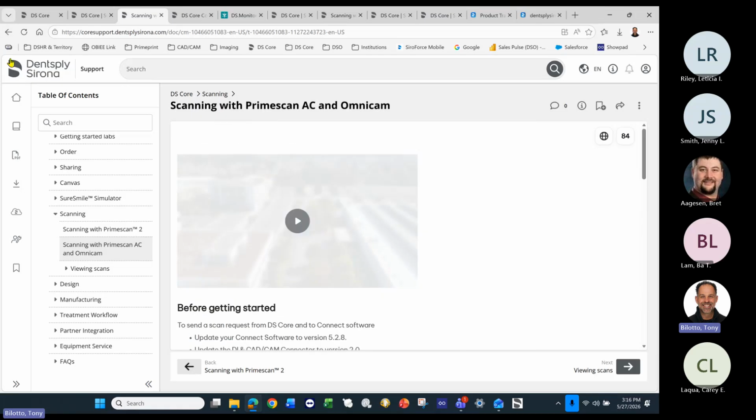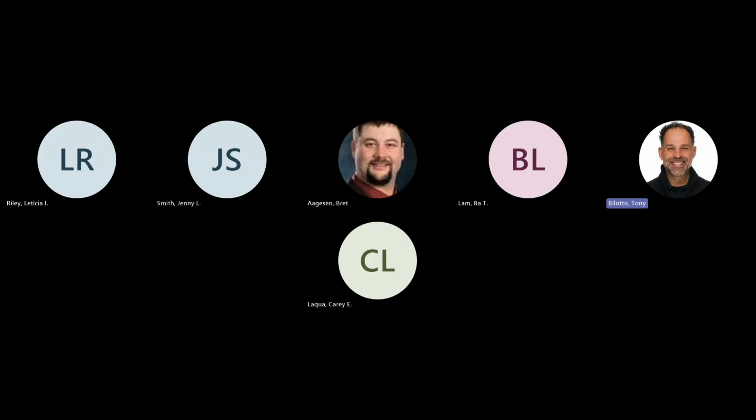Trying to see if there's anything that I forgot or didn't go through. I think that Bret's going to go through his part right now, so he's going to go through an area of how to do it for implants and such. So I'm going to stop sharing and let Bret share his screen. Taking over.